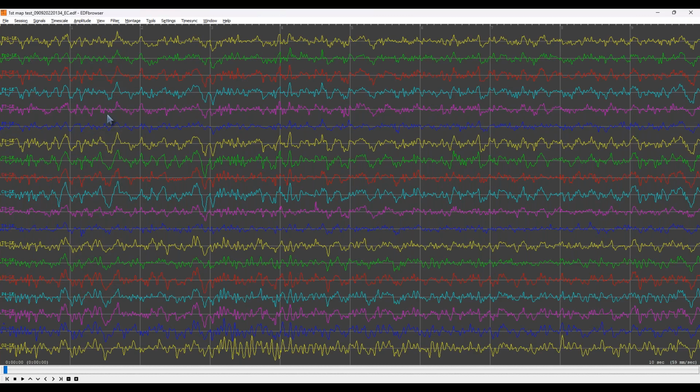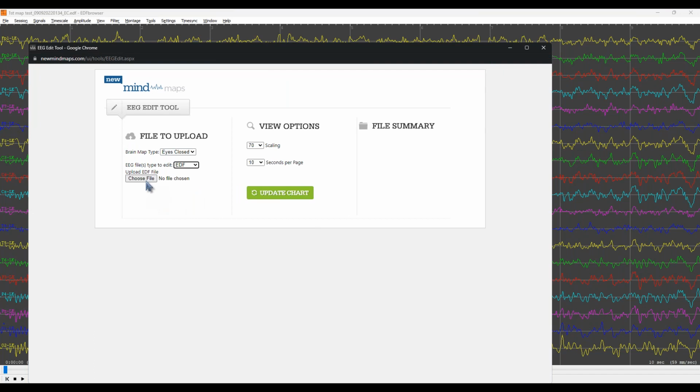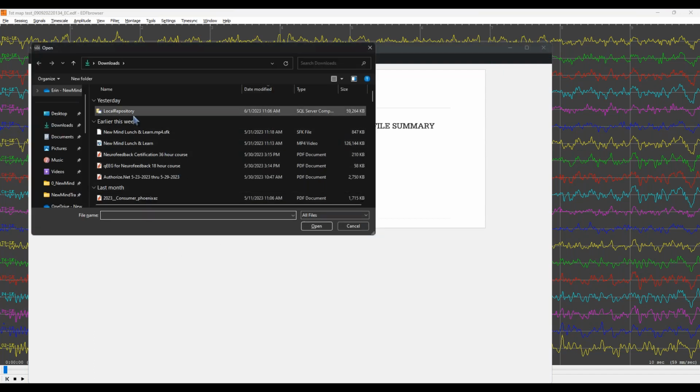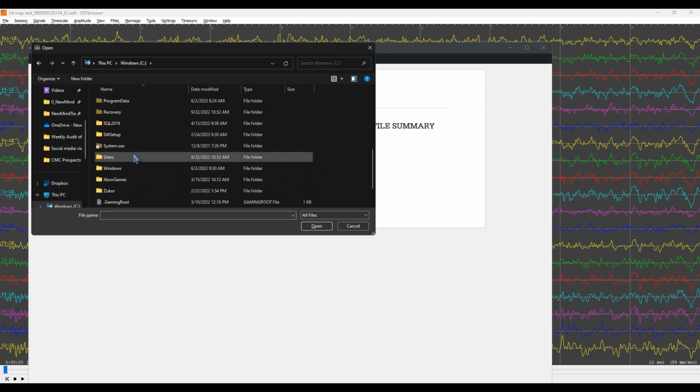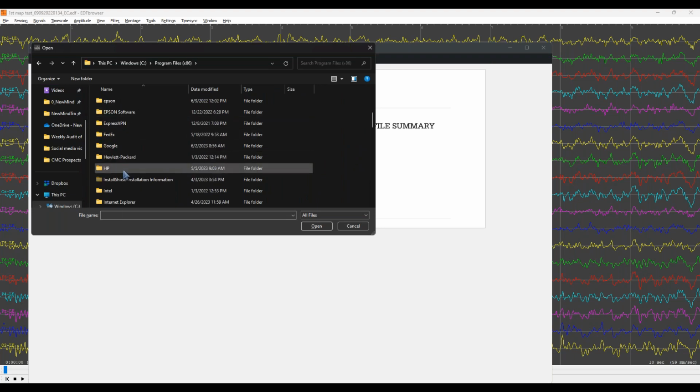Now, if you wanted to review, let's say, a map, let's just do this. I'll see if we can get up the same map in two different ones. So let's go to brain maps. Go to this guy. So let's bring this one up.